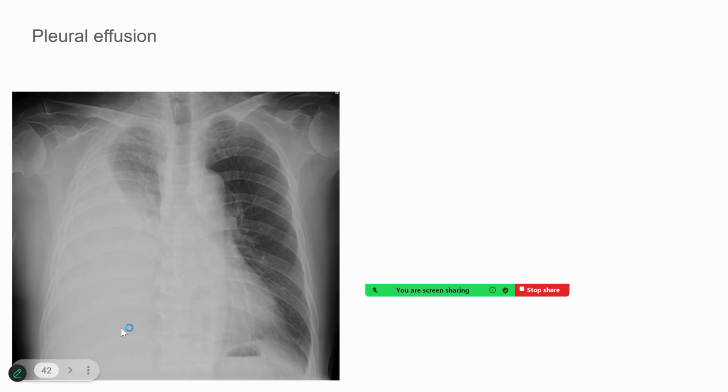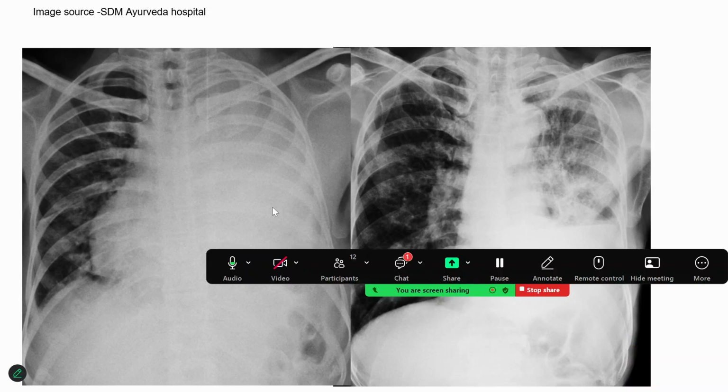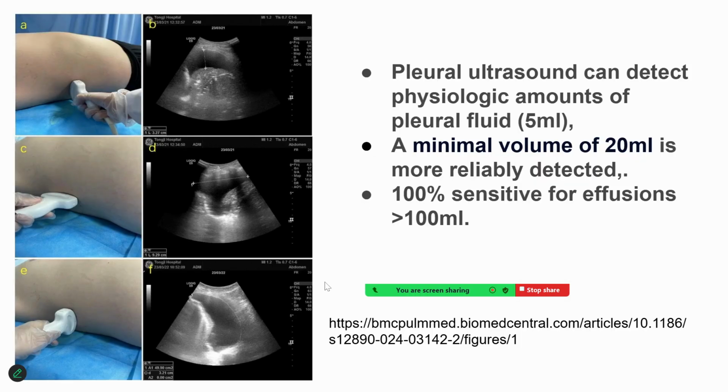Of course, clinical evidence of the pleural effusion will be a dull sound on percussion with absent breath sounds. Once the fluid is tapped, now, in this X-ray, of course, that displacement is quite obvious, visible in the first X-ray. Once the fluid is tapped, there will be a fluid and air interface. The air enters in, and if there is a fluid and air interface, you will find a horizontal line. Whereas in typical untapped effusions, the lines would be oblique as such. That's about certain of the variations.